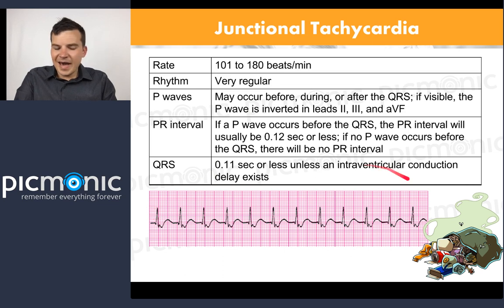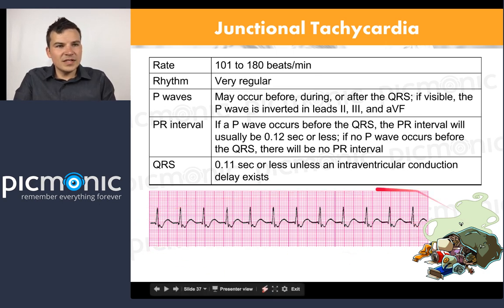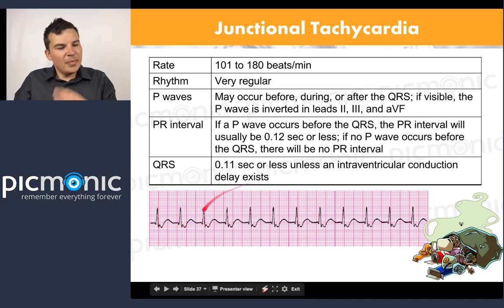So if I look at this rhythm, what's the rate down here? So let's follow the same pattern. Let's not skip ahead. 1, 2, 3... 12. I got 12. I hope it's 12. So I've got 12 here, so at a rate of 12, that's 120. So 120 or so. I mean, that's estimated, yes. But it's fast. That's the point.